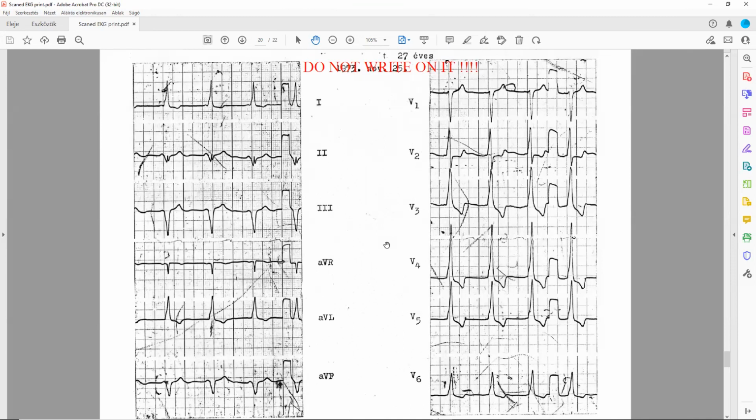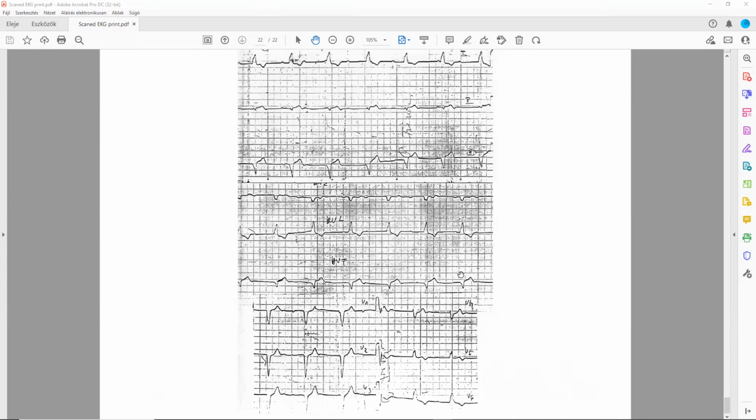It could be tachycardia. What kind of tachycardia can develop? This one would probably be the antidromic. Okay, so AVRT tachycardia can develop, and when it's wide, that means antidromic or orthodromic. These are the two different types of tachycardia that can develop, depending on whether the bundle activates the ventricle and the AV junction serves as the reentry, or the opposite, the AV junction activates the ventricle and the bundle serves as the reentry. Okay? Good. Very good.